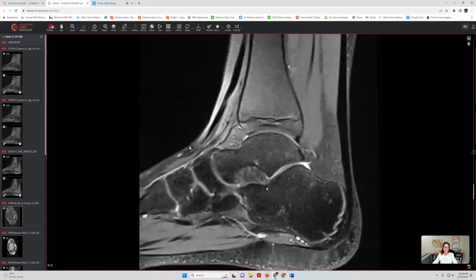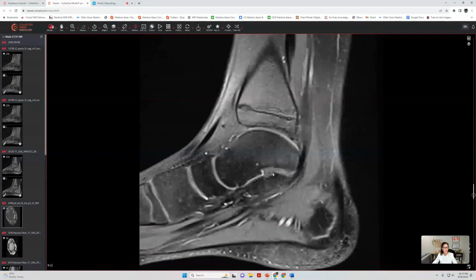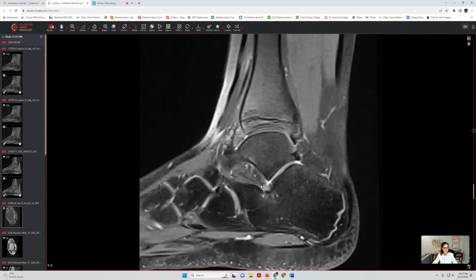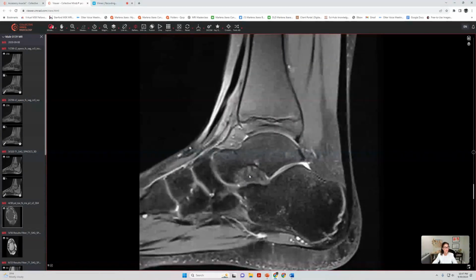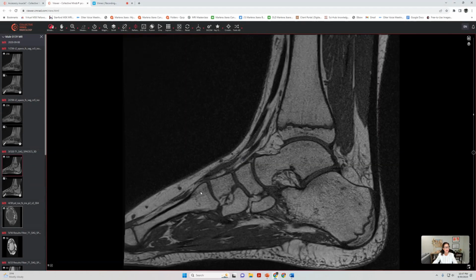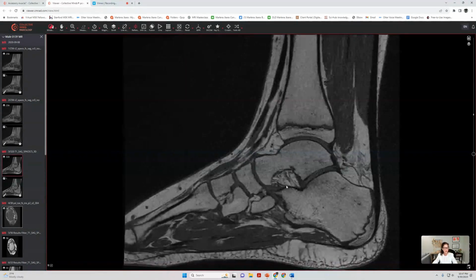This is very well seen sagittally, and when we go to the most medial aspect, we see a small hole. That's the medial aspect of sinus tarsi, which then opens up into a pyramid-shaped space. And that is seen laterally. And we can appreciate that there is no synovitis that's obliterating the fat space. We can see that also on T1 weighted images on sagittal where the fat is maintained throughout the sinus tarsi space.